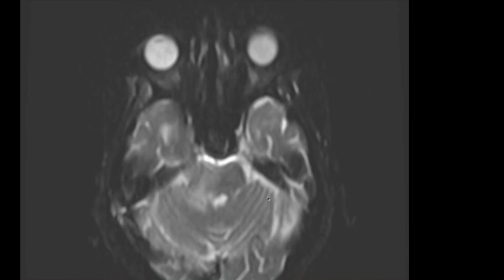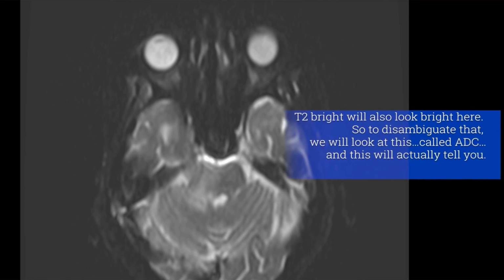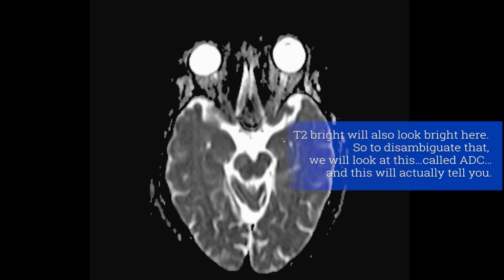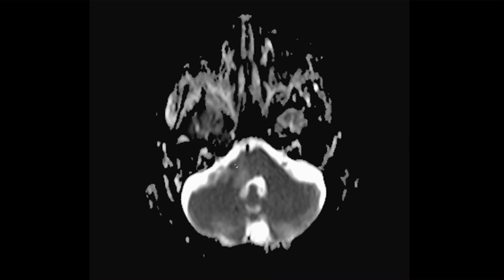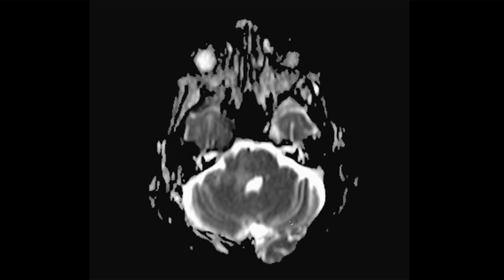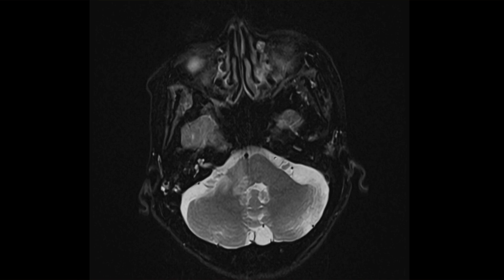The caveat to both of these things is that things that are T2 bright will also look bright here. So to disambiguate that, we will look at this, which is called ADC. And this will actually tell you, maybe there's some dark stuff in here. Maybe some of that is true reduced diffusion, but the other stuff that's still bright on the ADC that was bright in the diffusion is called T2 shine through. And that just means, we can go back to the T2 here, this is just bright because it's T2 bright.